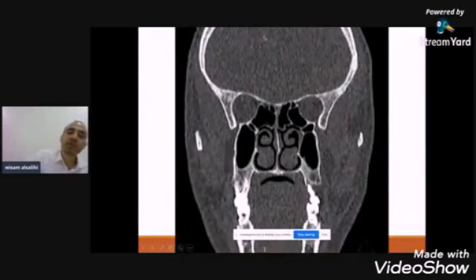Okay. More posterior. The posterior ethmoid is different from the anterior. The skull base becomes more horizontal and thicker. The posterior ethmoid cells are larger and triangular compared to the anterior cells. The inferior orbital fissure and the orbital apex are more posterior.